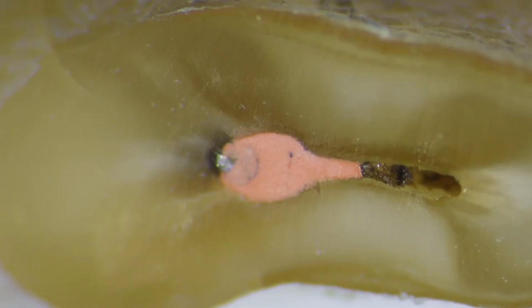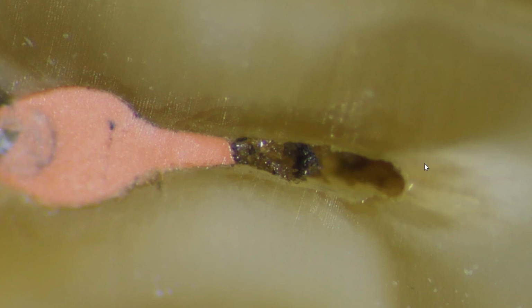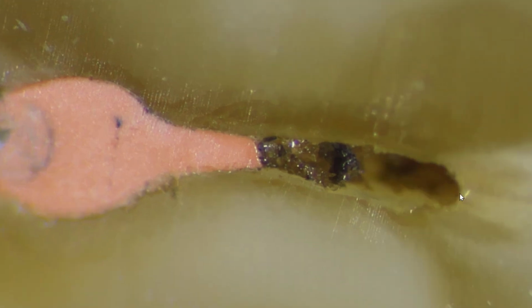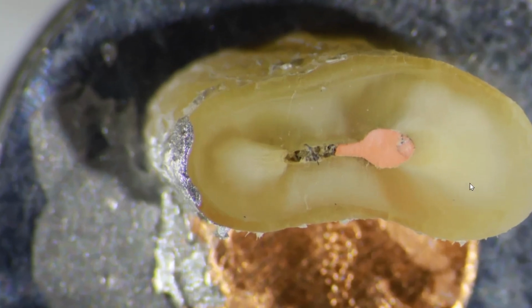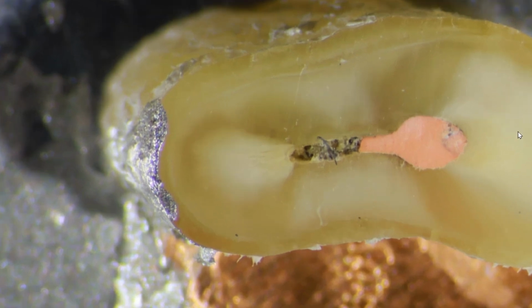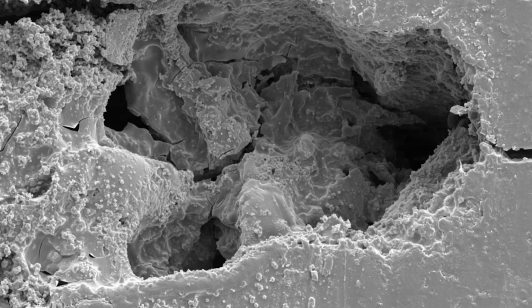This is section number 3, and pretty much the same thing. As we go more coronal, the oval part of the unfilled canal becomes larger and larger. And then we actually go in and examine that black, glassy-like material. And of course, it's just a calcified biofilm with basically billions of organisms. This is further up, and you can see how extensive it is and how much material really is in that space. When you look at things like this, you wonder why any endodontic treatment even works.